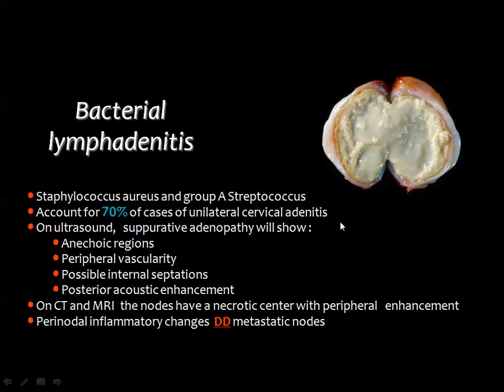When the lymph node is inflamed, then you expect that it will appear anechoic on the ultrasound. It will have some increased vascularity, especially along the periphery, and you expect a loss of the central fatty echogenic area. Instead, you may see some fluid inside the lymph node.